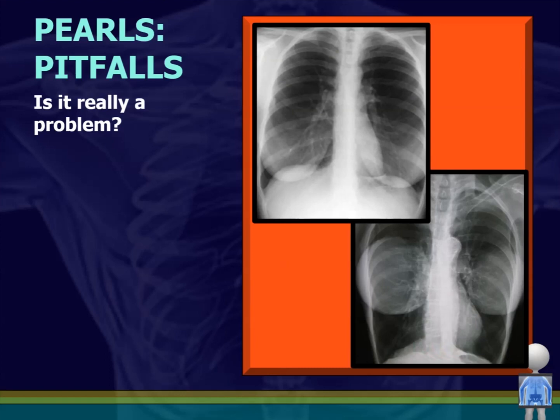These are more prominent than some, for reasons. This is a little more prominent than normal breast tissue would be, but I chose it just to show you how prominent normal breast tissue can look. But if someone's especially rotated, you might see a shadow of a breast and think it's something. Remember that breasts are usually dense enough to give a little bit of extra radio opacity, and they often show up on x-ray, so don't be fooled.